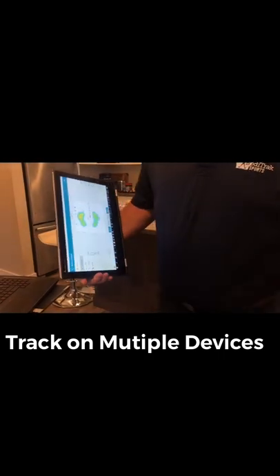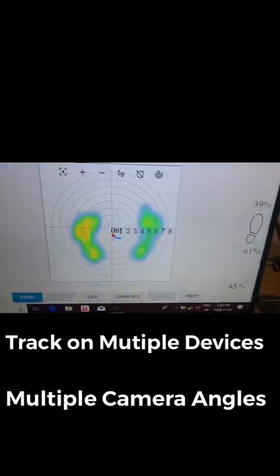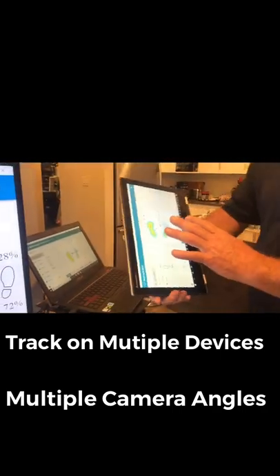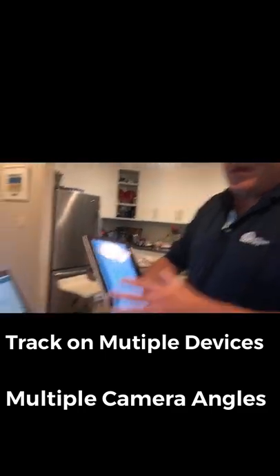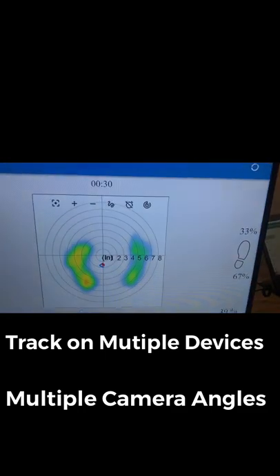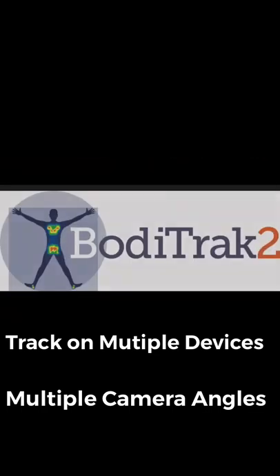So I'd like to point something out, absolutely mind-blowing. Not only are we wirelessly sending this information to the PC or a Mac, I'm actually capturing it on the tablet as well. So I can be monitoring this from a remote location. So we have capabilities now beyond comprehension in terms of what we were able to do just a year ago.